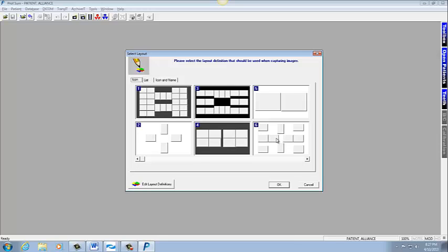Again, here's also another layout. This would be great for a child if you want to just take either two or four bite wings and a couple PAs. Again, you have some room for any retakes that you need.